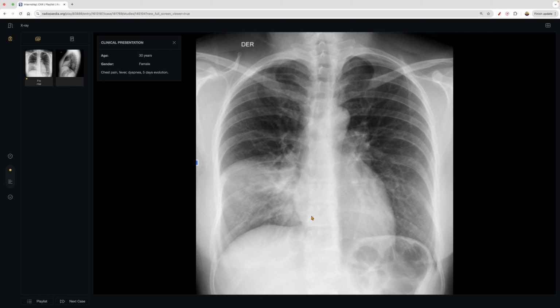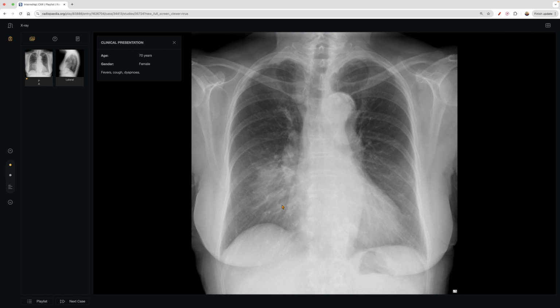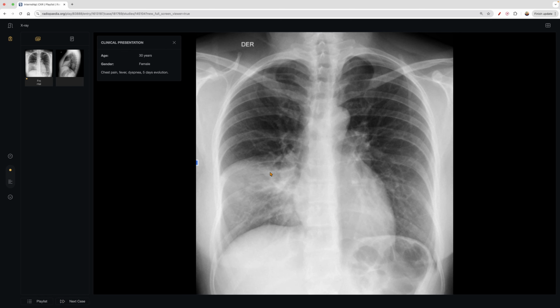Now this one is a little tricky. We see here that this is the location of the right middle lobe, the lung zone, lung region. But in this case, you can see the heart border really sharply. That silhouette is there, so there is no silhouette sign, meaning the silhouette is not gone. With that being said, this is actually a right lower lobe pneumonia. Typically in right lower lobe pneumonias, you actually lose the right diaphragm. It becomes hard to visualize, and so that gets silhouetted out. However, this is the superior aspect of the right lower lobe.